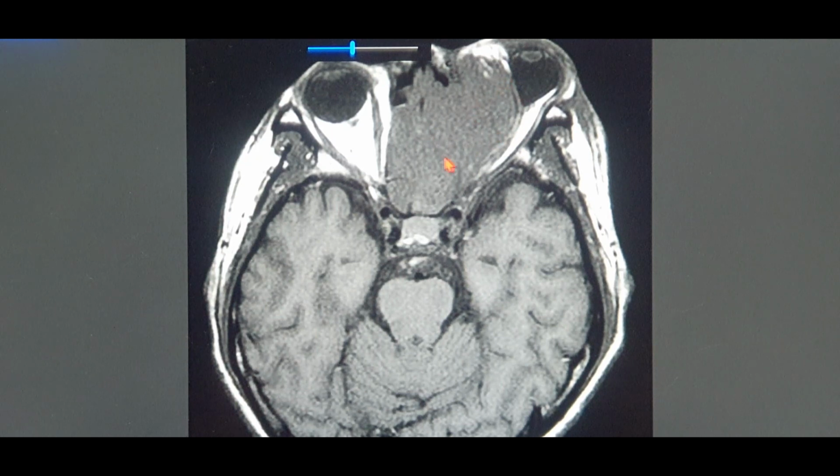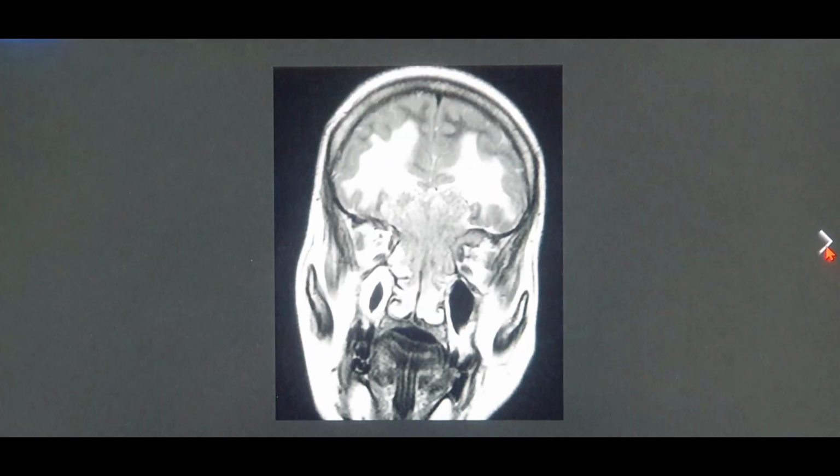And as we all know, the olfactory neuroblastoma is a malignant tumor. So we may have to do an orbital exenteration in this patient, if at all needed, to prevent the recurrence and the distant spread. So this was the second photograph, the axial section.